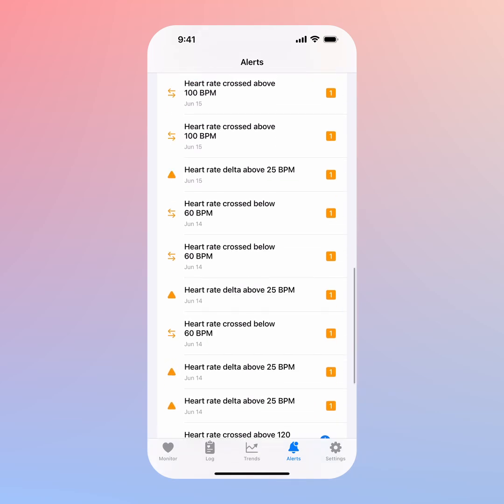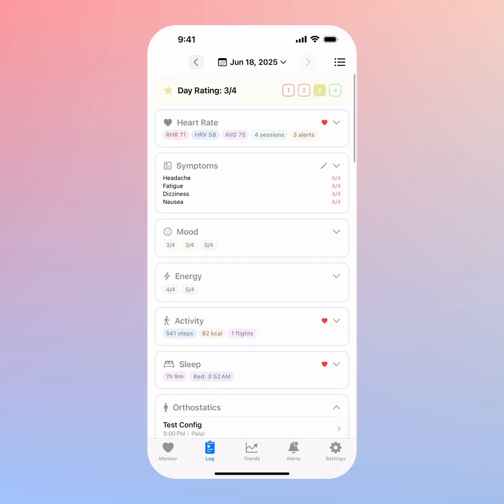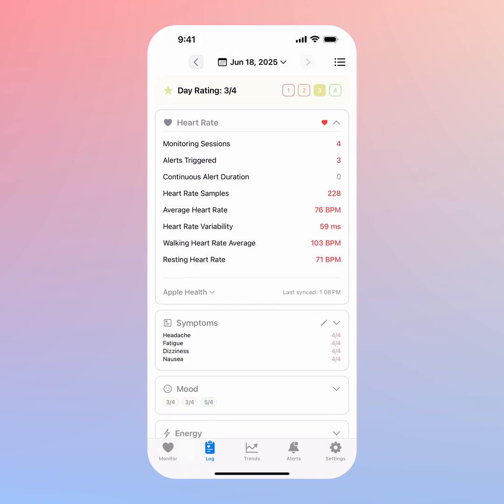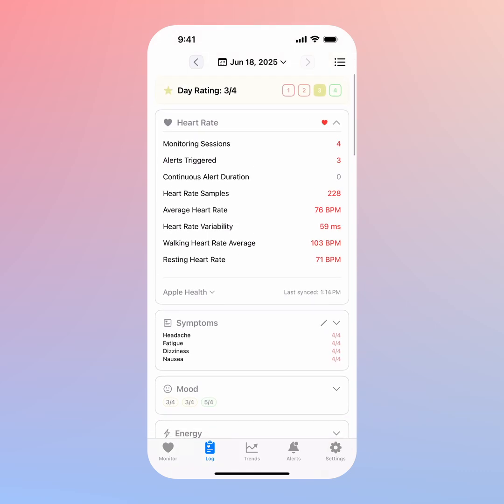But yeah, one thing I haven't done yet is HRV tracking. Right now I have a heart rate card here that pulls in HRV data that's automatically calculated by your Apple Health or Apple Watch. But I want to implement the camera-based method, which I think is more robust and more reliable. And I think that's definitely on the roadmap.